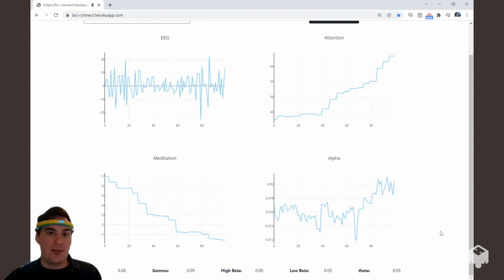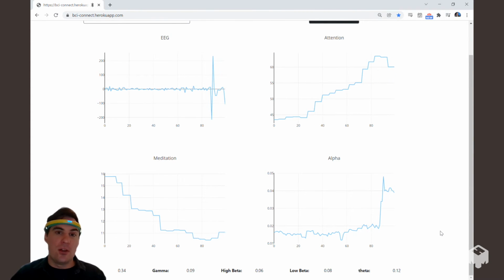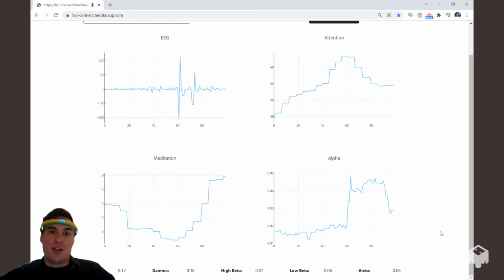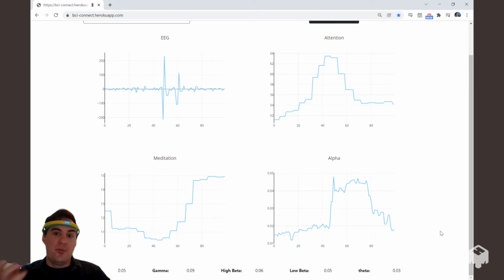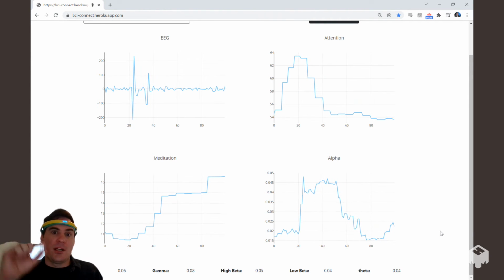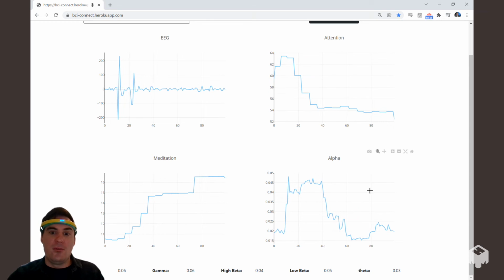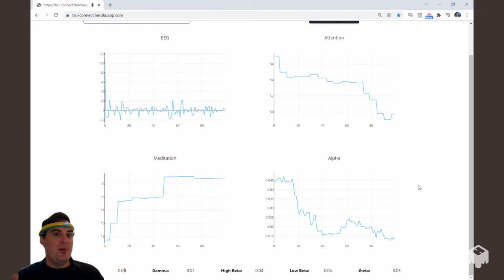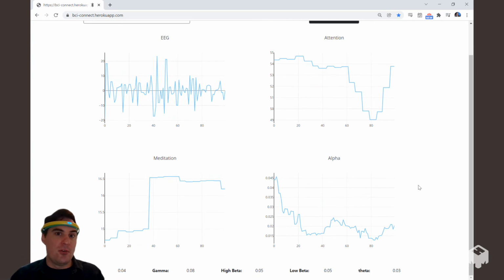These are alpha waves. You might have heard of these. These are correlated with all kinds of concentration, sleep. You've certainly heard of alpha waves from your brain before. So let's see something very simple that we can do to get these a little bit higher. So if we want this alpha wave reading to be a bit higher, we can actually blink again. Why does that happen? Well, you'll have to take a look at our curriculum to find out.